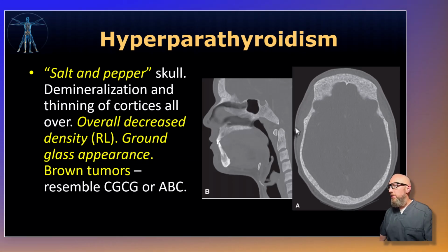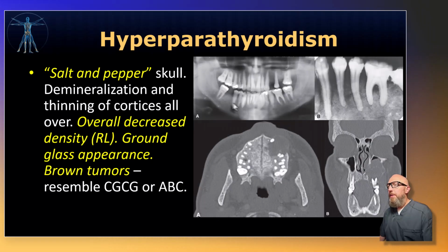This just generalized ground glass appearance. Usually you see marrow space in here. You usually see a definitely pronounced outer and inner table of the skull, but the internal pattern is completely granular, and there's generalized lack of a defined outer cortical boundary on the osseous structures. The bone has essentially lost its edges, including here throughout the skull base, throughout the spine, throughout the maxilla, and the mandible. Does something stand out about this panoramic image specifically?